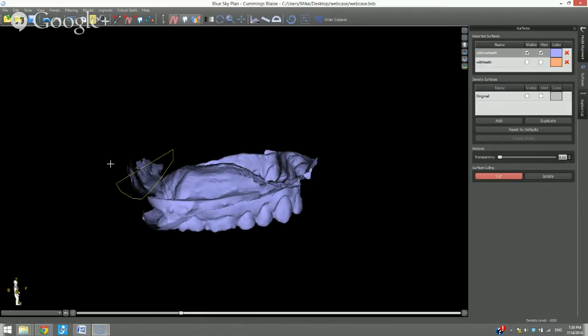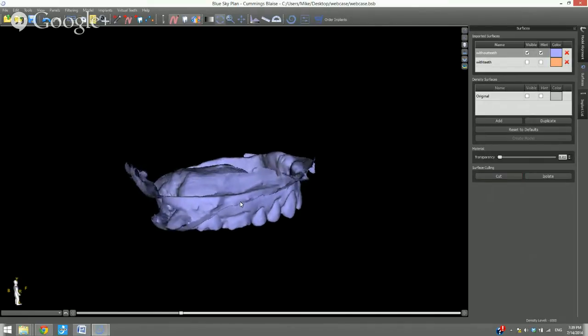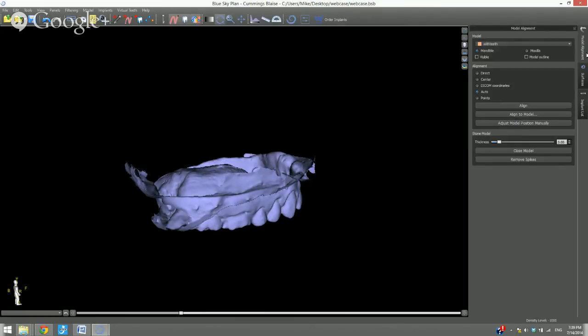And then you could add the base to that. Okay.